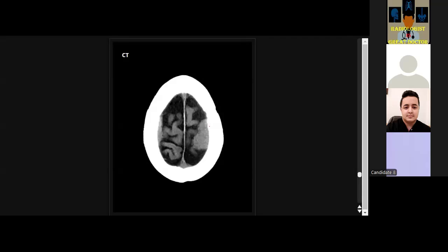This patient, do you want to ask anything from the history? Any differential diagnosis for meningioma? A dural-based lesion, meningioma. Extra-axial dural-based lesion, hemangiopericytoma is another differential, but it would cause more bone destruction. It is a more aggressive lesion. Another could be epidermoid cyst or dermoid cyst, which can present like this, but they are cystic lesions, similar in signal intensity to the CSF.